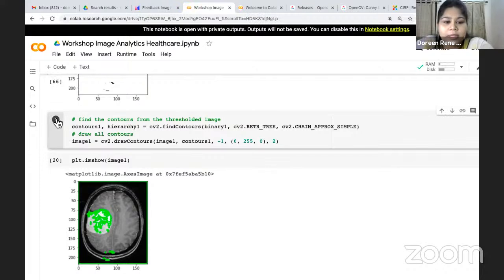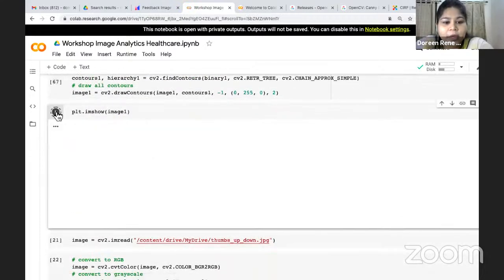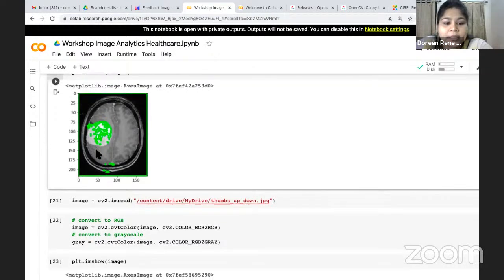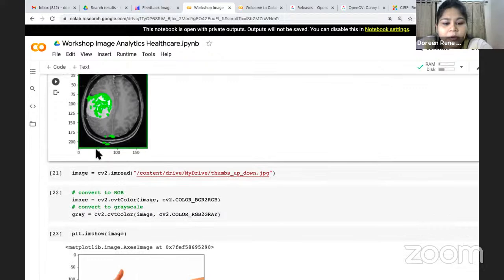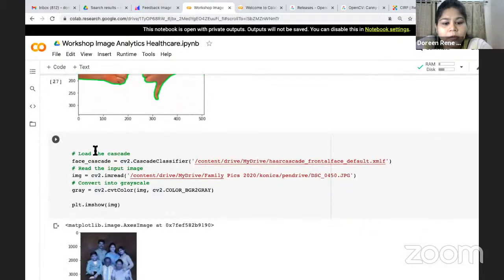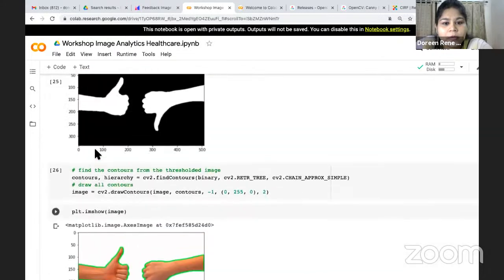Contours of color intensity. And I could see it. Here, you can see it is not taking the entire image, only the object present in the image, depending upon the color intensity. Able to find out?